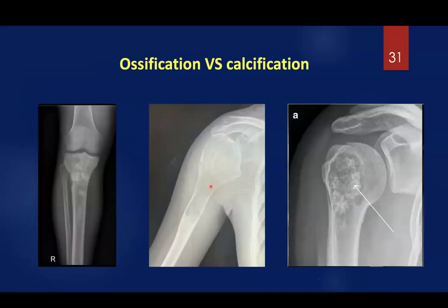So now look at these three cases of our practice. This case is a 22 year old male patient. You know there is bone lysis and destruction inside. You don't know where is the beginning, where is the end. And it's permeative, with a very wide zone of transition. And look at the whitish structures here. These whitish structures, or whitish matrix, are a bone forming lesion. And the diagnosis of this patient was high grade conventional osteoblastic osteosarcoma.